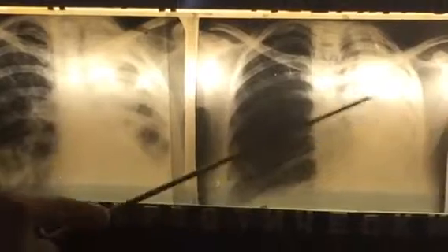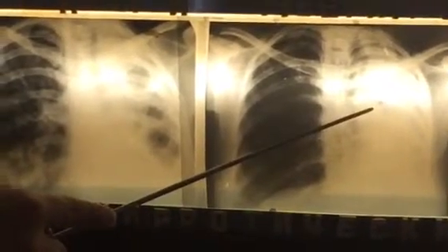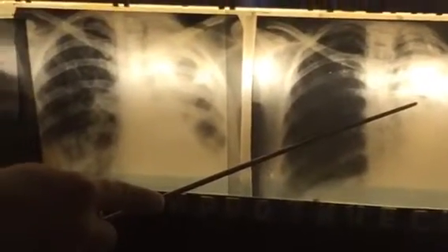What is this shadow? It's cirrhotic TB. Cirrhosis, yes. What is it? Trachea. Yes, it's the trachea. What is it? Left main bronchus, right main bronchus. You see, but the trachea must be placed here. Yes, you see deviation of the trachea and bronchi. Why? Because the organs of the mediastinum deviate to this side.